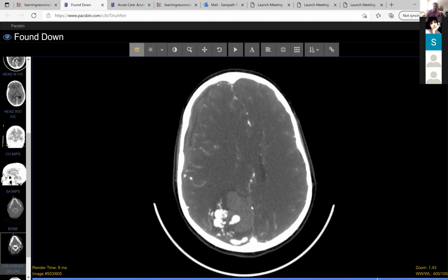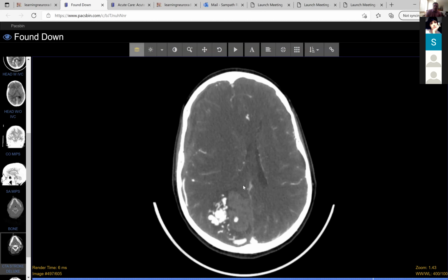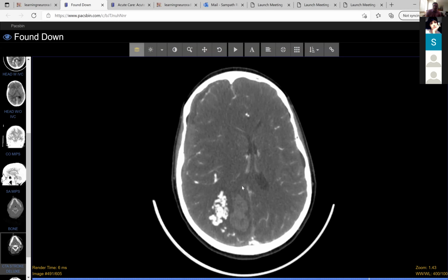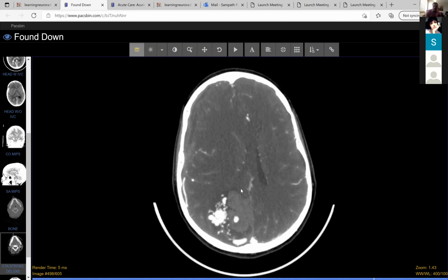So this patient has a congenital problem where, as his brain developed, he formed a tangle of vessels, a bunch of vessels which have developed abnormally. These are vessels that tend not to form properly. The walls are very, very thin. They're very fragile. They form in places where they're not supposed to, and they can rupture and cause a huge bleed. That's what happened in this case.